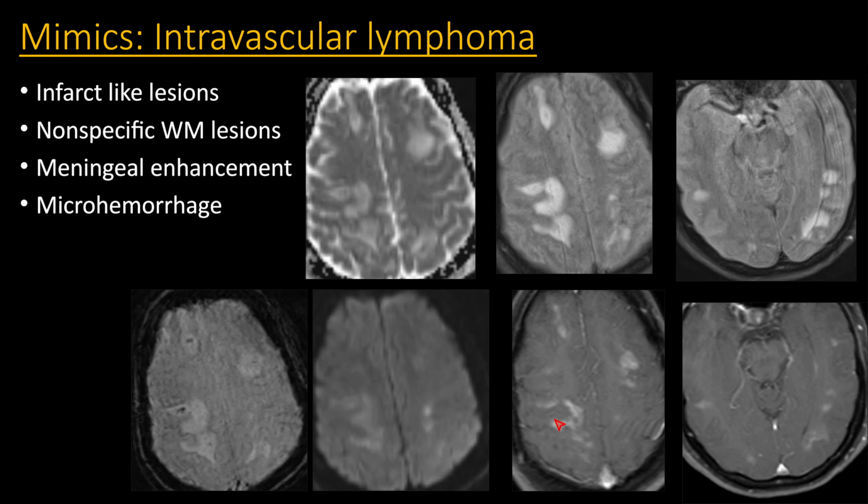So very heterogeneous appearance; it just looks like something inflammatory. You wouldn't be wrong in thinking it's some sort of inflammatory condition. In fact, some of the lesions would be good for something like ADEM, and then with the presence of this hemorrhage, perhaps this is AHL or Hurst disease, the hemorrhagic form of ADEM. And that's sort of clinically what this was thought to be for a while. This was like Hurst disease or hemorrhagic ADEM, but obviously it ended up being diagnosed as intravascular lymphoma.